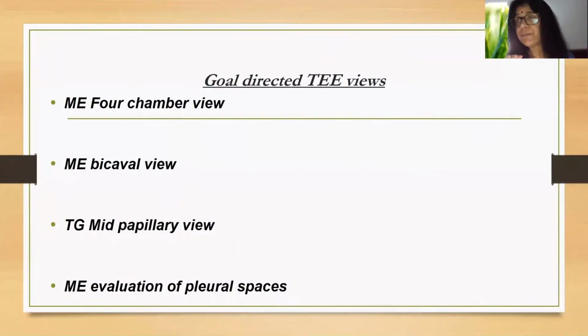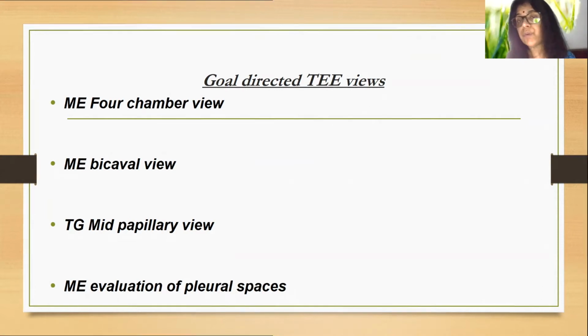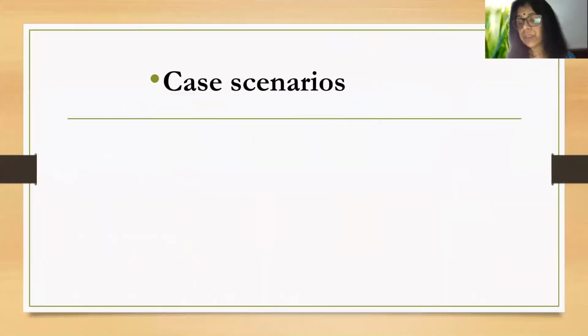But there are few goal-directed TEE views which can be used in a trauma patient, which are mid-esophageal four-chamber view, mid-esophageal bicaval view, transgastric mid-papillary view, and evaluation of the pleural spaces. Let's go to some case scenarios.